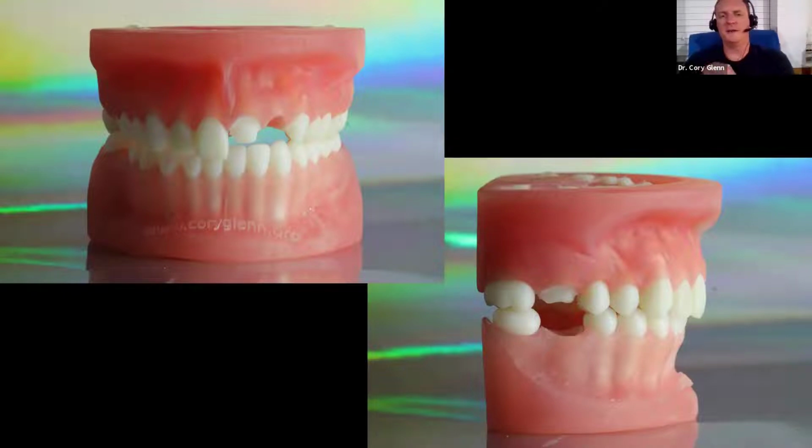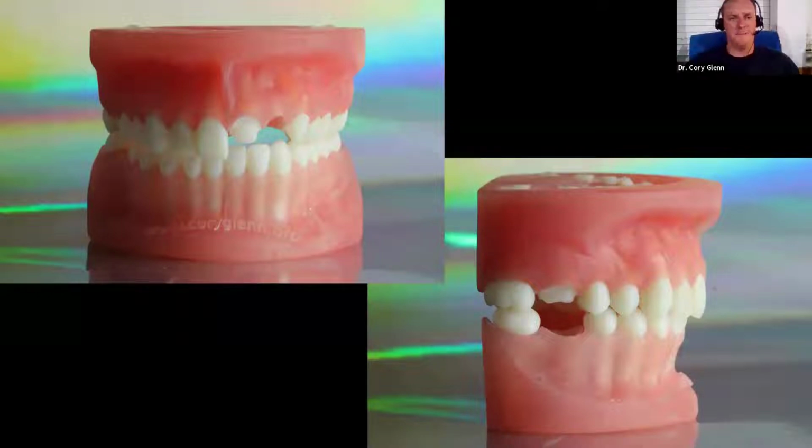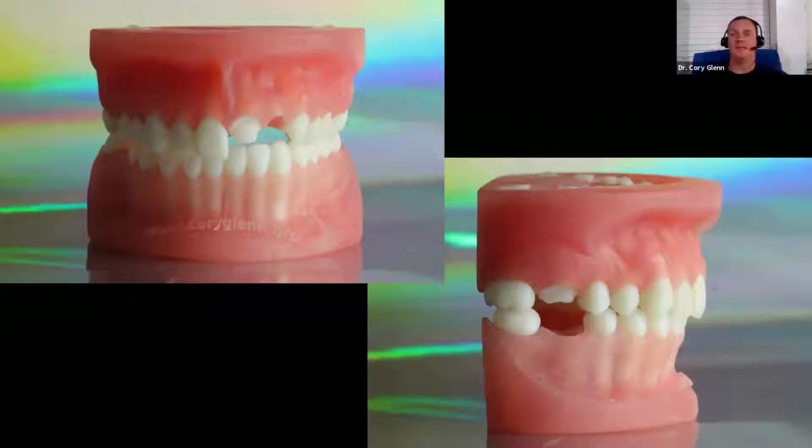Michael, are our articulator functions live yet in the software? Because I know we've got versions of that I've played with, but I lose track of what's live and what's public. Yeah, you could import the different bites. You could have the lower jaw open and close, move to different bite positions, view the contacts as it's moving from bite to bite. Yeah, that's live in the software. And that's in model editing, right? It also exists in ortho. There's actually a panel for buccal bites that focuses on the functionality. Okay, so yeah, that's the answer.